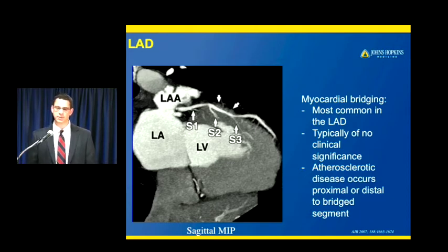So usually our rule of thumb is if we see a very deep bridge or a long bridge and the patient has no other explanation for their symptoms, that might be worthwhile getting a stress test in that patient if there's continued concern for possible anginal symptoms.